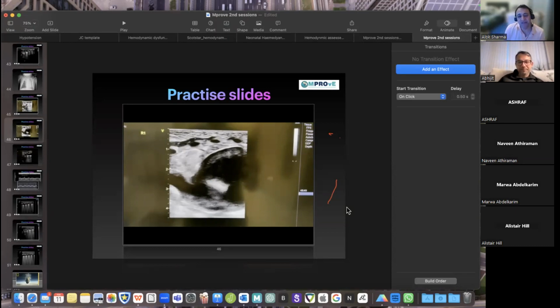Just to be aware, Marwa, thymus can vary in size. You might have babies who have very small thymic shadows, but if you have quite large thymic shadows, they can encapsulate the upper ribs. But also be aware that thymus can be left or right-sided. It's really important that when you're looking at it, as Abhijit said, a well demarcated lesion with a capsule with blood vessels within it above the level of the heart would fit more with a thymus than an atelectasis or consolidation.